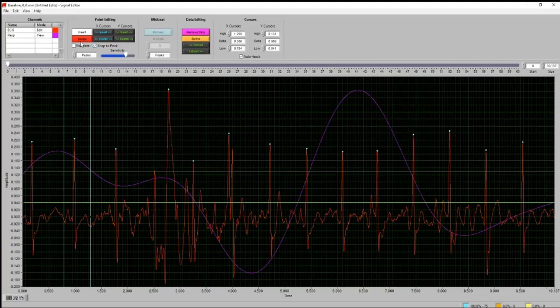So for instance, in this case here, just by looking at the general structure and looking at thousands of ECGs, this one appears to be an actual beat right here. But this is difficult. This is not something that you could easily give across a couple of students who might be rating this data and ensure that they're all going to pick the same point every time.